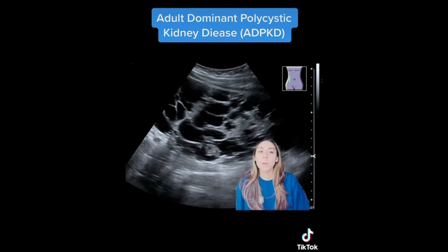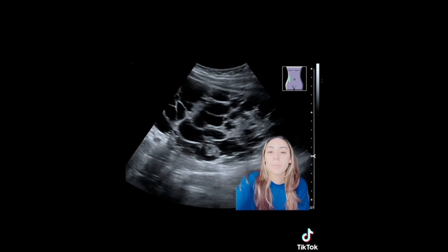The prognosis is really just dependent on the development of the cyst formation, and sonographically we are going to immediately see the cysts kind of consuming the whole kidney.